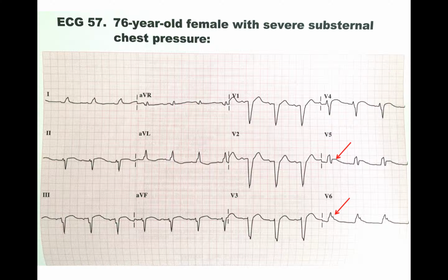It's neither tachycardic nor bradycardic, so we have a rate between 75 and 100. Another thing that we're going to look at is rhythm. The first thing you want to check is, is there a P before each QRS? And is there a QRS after each P? I'm going to try to see if I can find a P here.